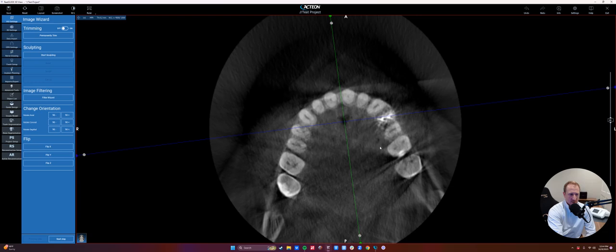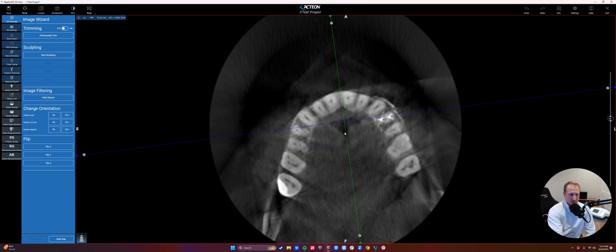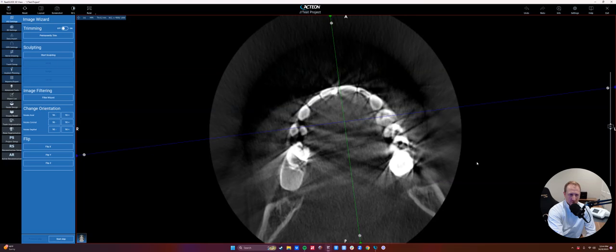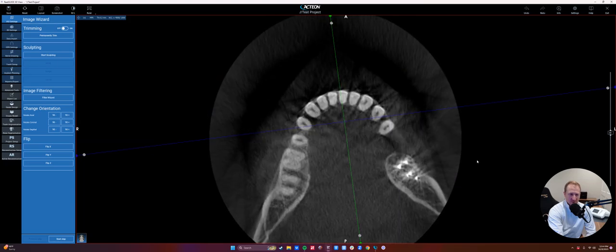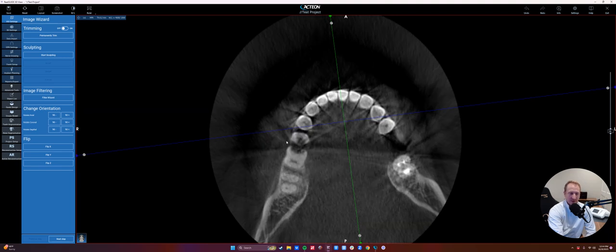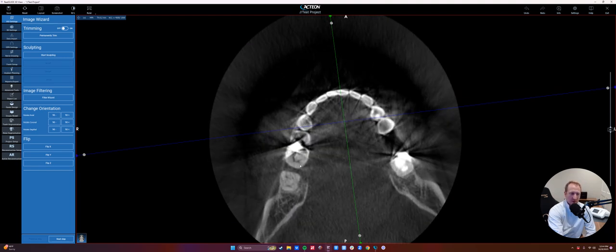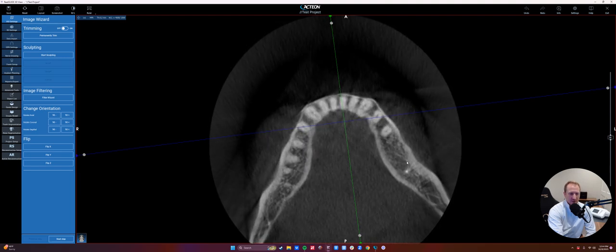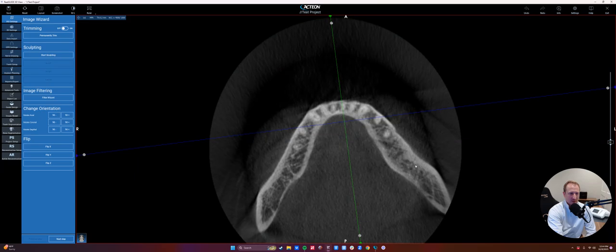There's a root canal. Okay, and we're just looking generally for asymmetries. We're not getting too specific. As we come down to the mandibular teeth here, we can see some large caries perhaps. Looks like a recurrent decay under some sort of amalgam or metallic filling. Another root canal here, and here's an edentulous span where we'll probably try to place an implant later.